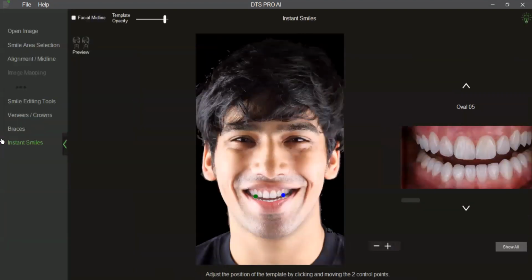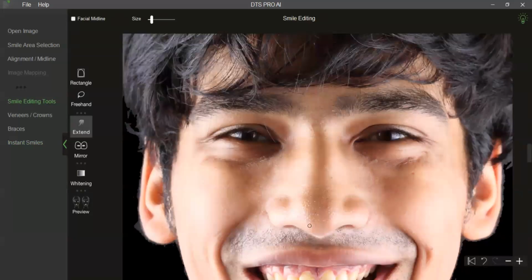Right. So that was about Instant Smiles. I hope I am clear up to this point. If there are any questions, I'll be more than happy to take them. We go on to the next screen, which is the smile editing tools.